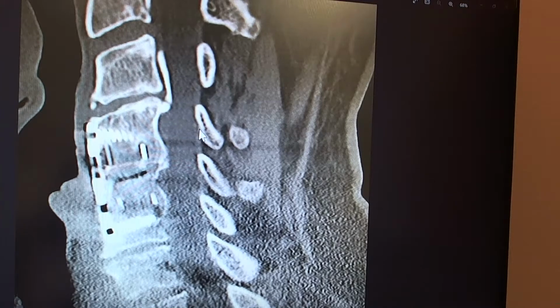answer that. I see your comments. Please keep commenting, and if there's something specifically needed to be known about this, I'm happy to explain it more. You see the spinal canal here. In this window, obviously, you don't see the spinal cord. As a matter of fact, if you need to see a spinal cord, you would have to perform a myelogram. Even in the tissue window, it becomes really hard to say much more about the spinal cord.